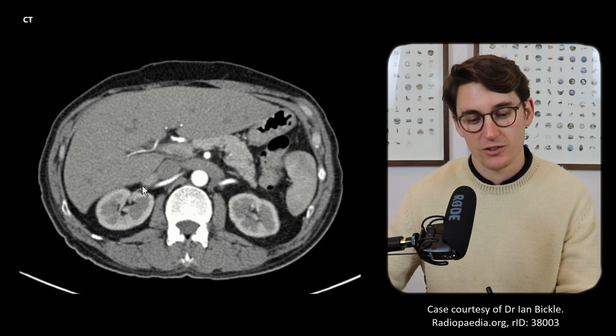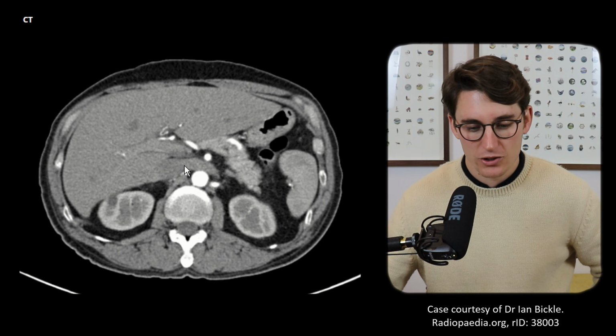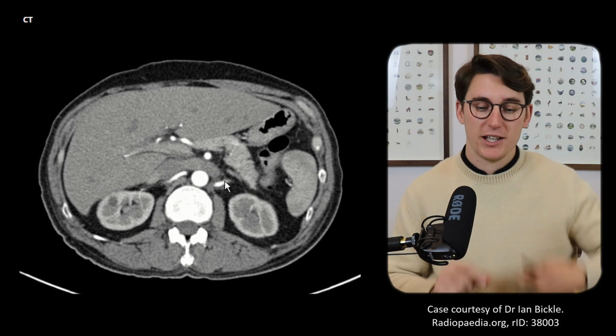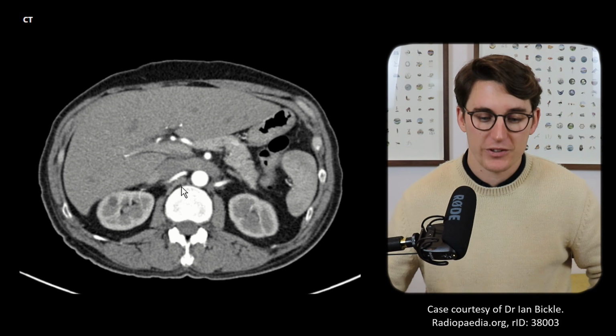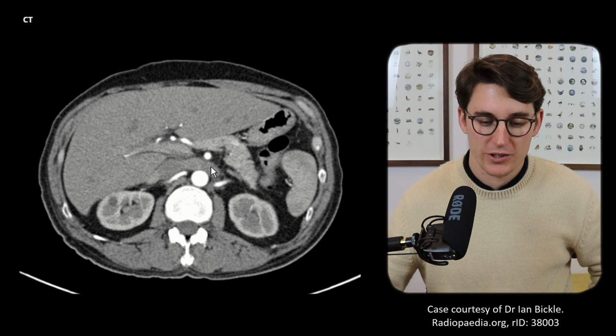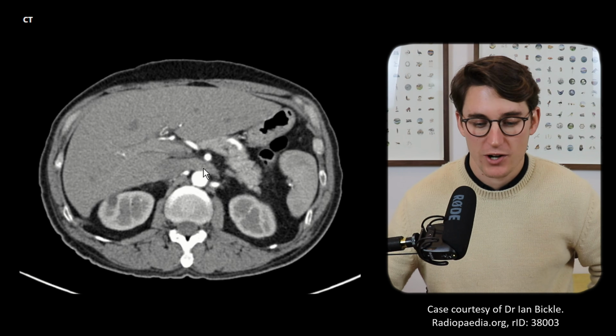You see our right renal vein doesn't need to cross the midline, but our left renal vein goes across like that. And our SMA, if the angle between the SMA and the aorta is too sharp and there's a lack of visceral fat here that's helping that SMA to stay off of that left renal vein, we can actually get pressure on that left renal vein. That's what's known as nutcracker syndrome.